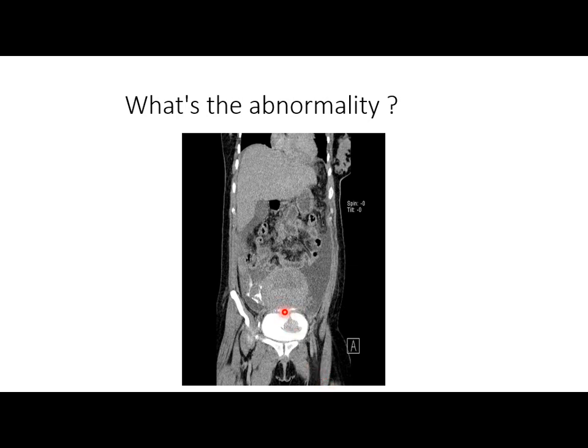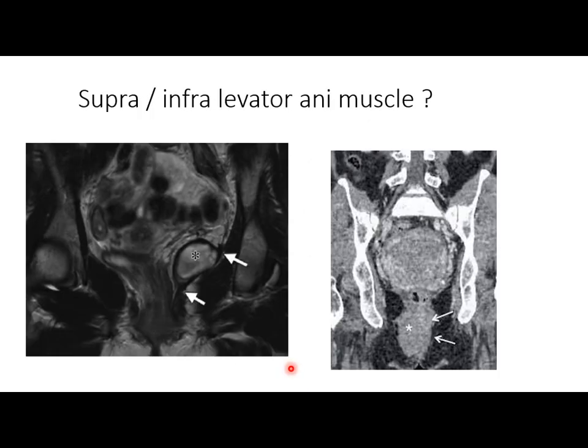Extravasation. Rupture of the bladder. Extravasation of urine outside. Intraperitoneal, yes. Is this supra or infra levator ani? It is supra.